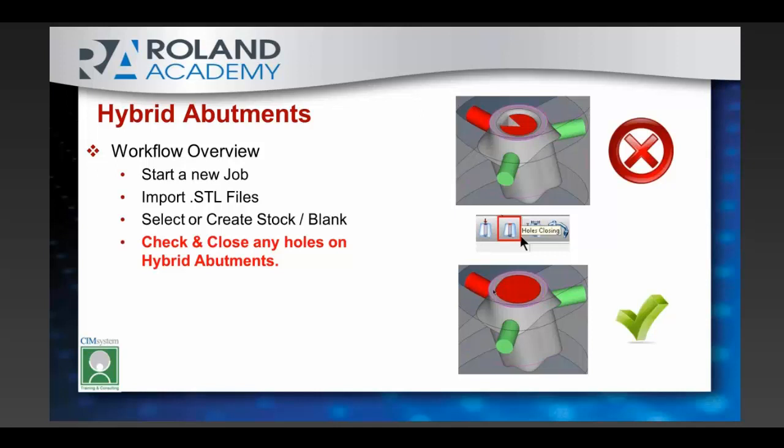Hybrid abutments have a little bit different of an interface, and they're kind of unpredictable because there's so many different libraries of hybrids out there, and the internal structure of where that cement goes and where you place the titanium interface in, those are all going to be different, going from one provider of a hybrid abutment to the next.